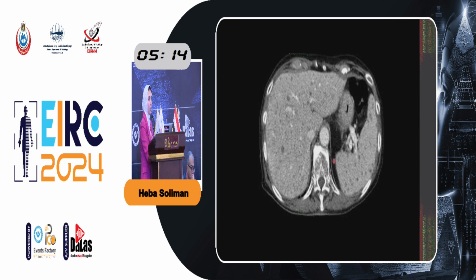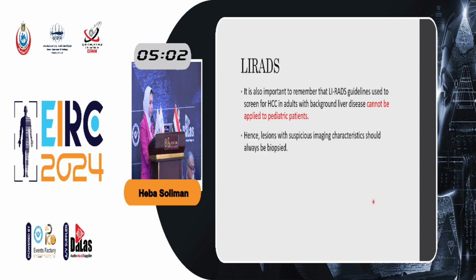If you find these lesions in the liver and the spleen, you can confidently diagnose this case as hepatosplenic candidiasis in a patient with febrile neutropenia.